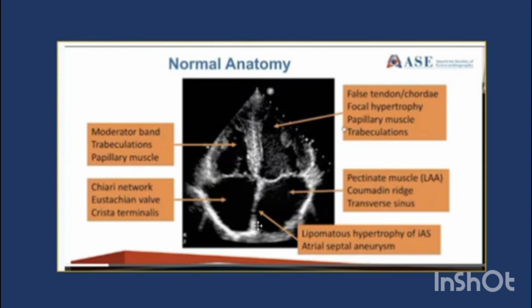In addition, you can have an aneurysm of the interatrial septum, where the septum is sort of excessive and floppy and flops more than 1 centimeter in either direction into the left or right atrium. Sometimes when I note that on an echo report, we get calls from the medicine team or other consultants not sure what that means. We have to reassure them this is a normal variant. Sometimes there is increased association with septum secundum ASDs or PFOs, but usually it is of no significant clinical significance.